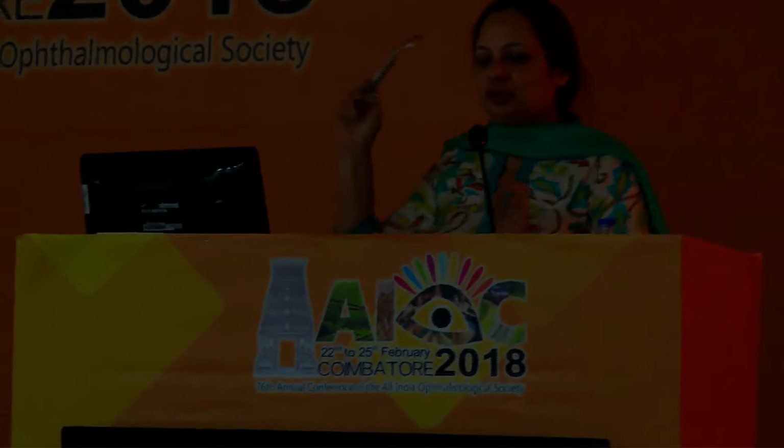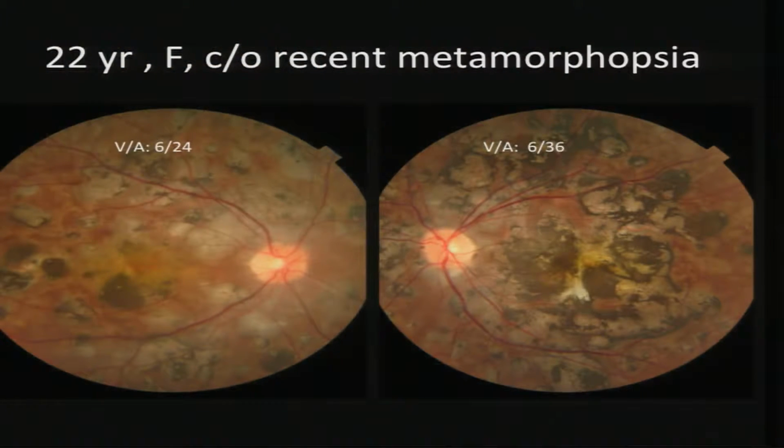I'm just going to show you two cases because there was a question asked right in the beginning that we do have OCT angiography now. So we see something new, we don't know what it is, how do we compare it with the gold standard, and how do we know what we are seeing is right or it's just one of the findings. So let's go over two patients where I'll show you how angio OCT helped us in managing these patients.